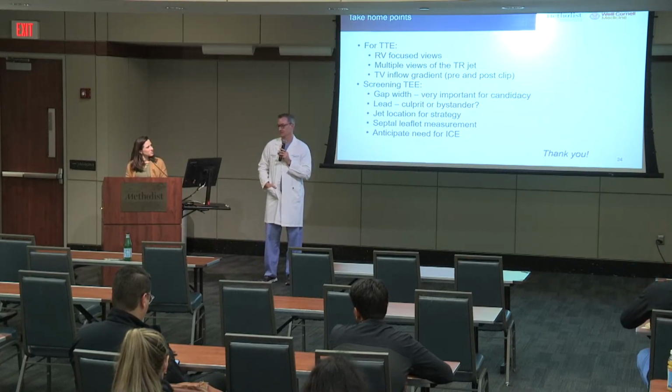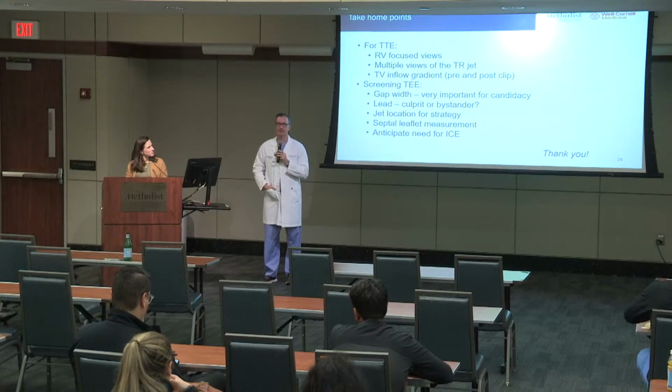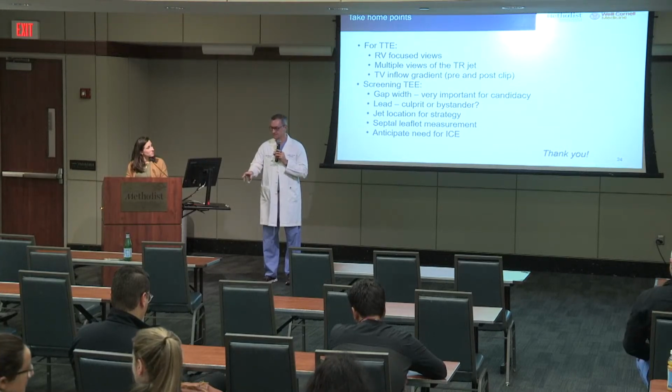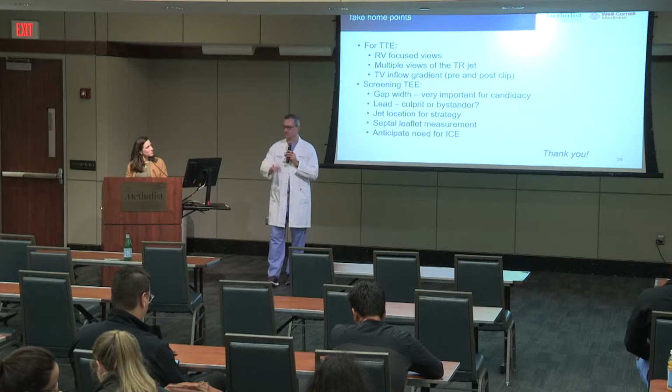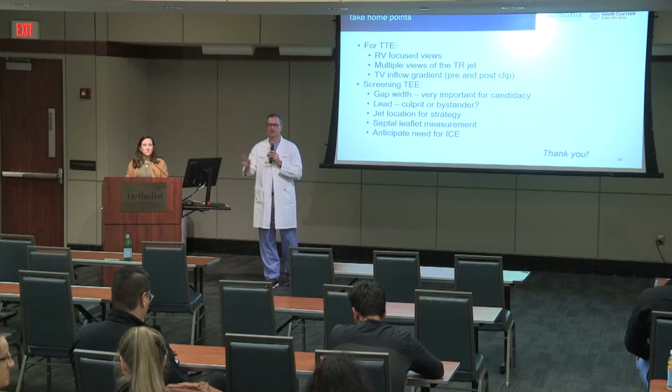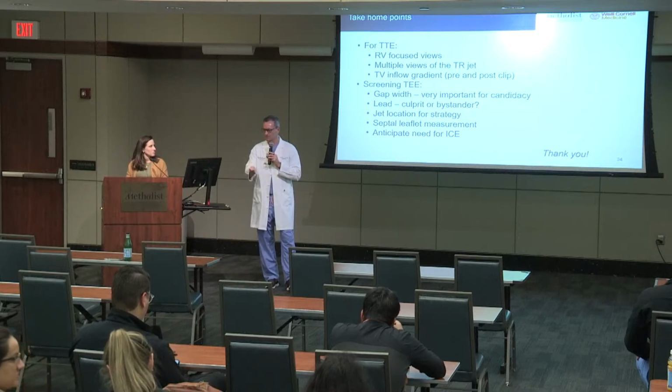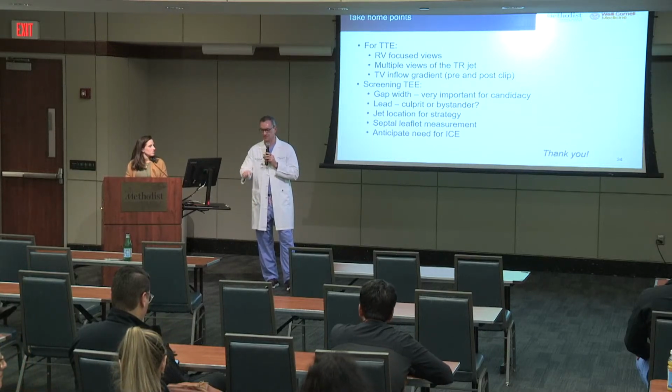So we cut our teeth with no ICE, and then it was a 2D ICE, and then it was a 3D ICE that wasn't Philips, so it wasn't integrated into the box. So it was more challenging because they would actually interfere with each other. You had to pause one and start the other one, and it was a little painful, but now it's all one console. You just toggle between them, which is just like going between a transthoracic and a TE probe. It's just a single button.